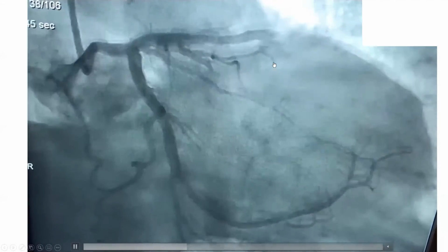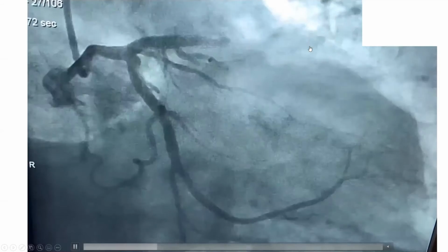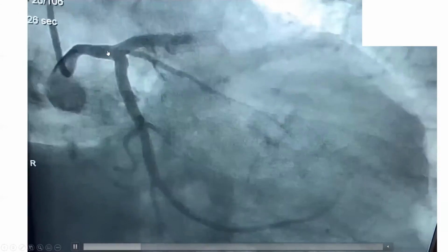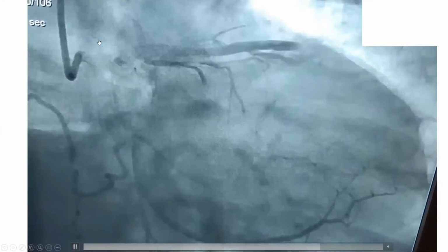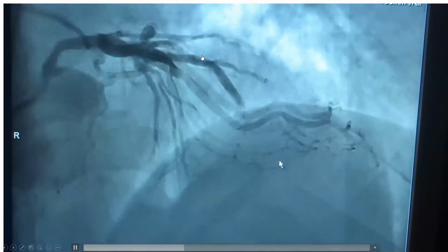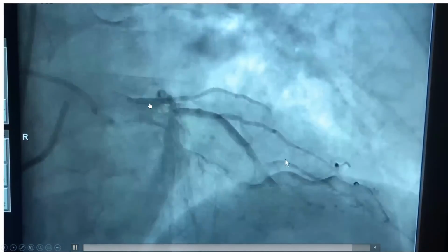The first one is a clot formation in your catheter or an atheroma that you cut from the aorta and you injected it. The second differential diagnosis is dissection. But typically, dissection starts at the guide. So you engage, maybe it was a difficult engagement, and you dissect from the left main all the way down. But this doesn't look like a dissection. If you look at the images, there is no dye stain. Usually with dissection, you will see a double lumen with dye hang up. There is no such thing here.